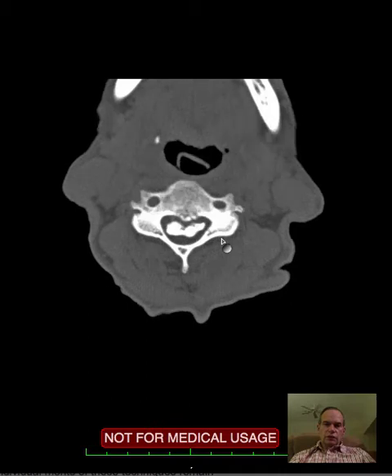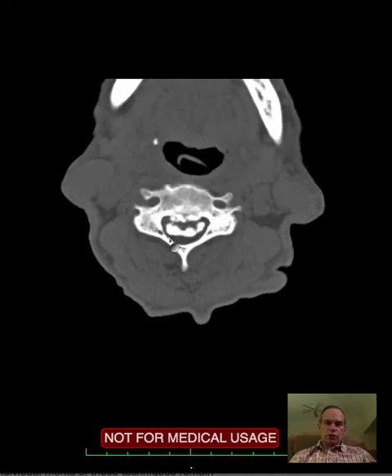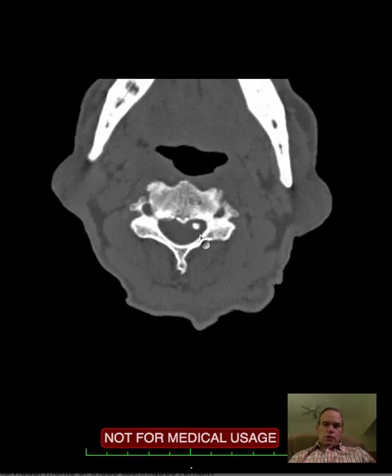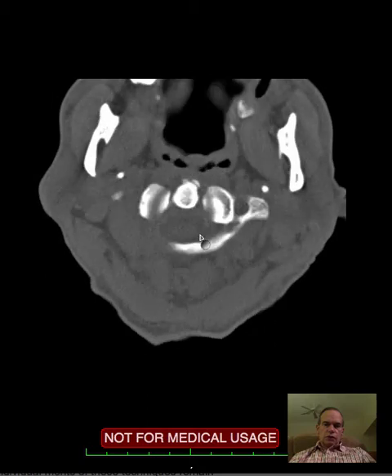The cervical spinal cord lives in here somewhere, so at best it's flattened, and since this develops over time, the cord somehow compensates for this process and retains most of its function, but there's a point of diminishing return, and this can become very crippling. So, ossification of posterior longitudinal ligament.